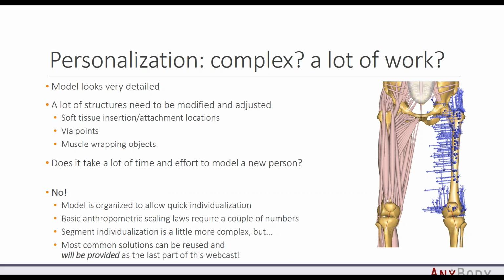And in the end of this webcast, I'm going to present a couple of different solutions that are quite common, and together with the tutorials, they complete a set of most probable scenarios that you could face. And I'm going to show how the models are constructed, explain what is done, and later on we will share all those models.